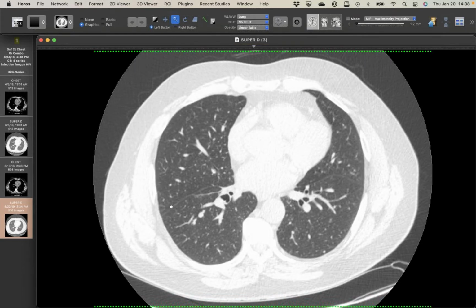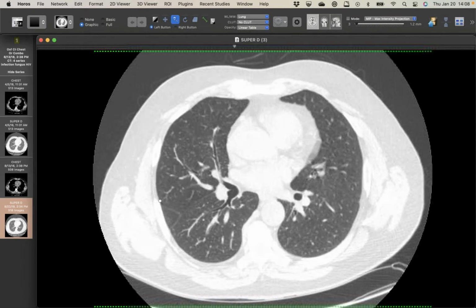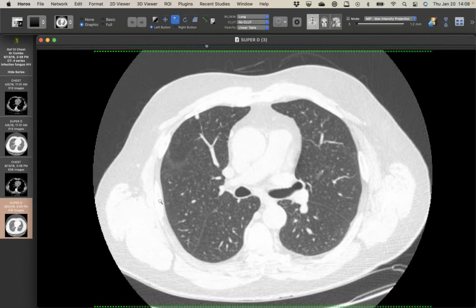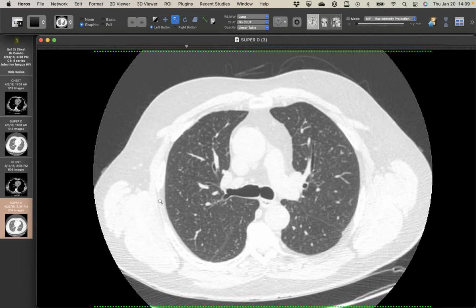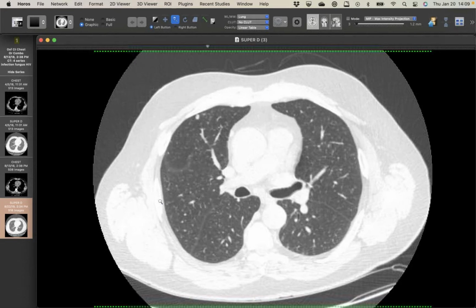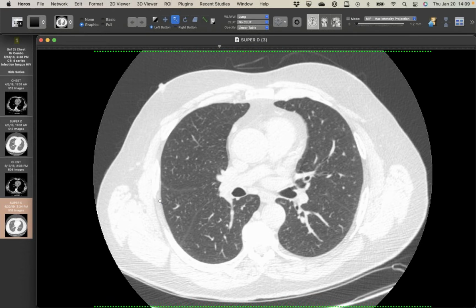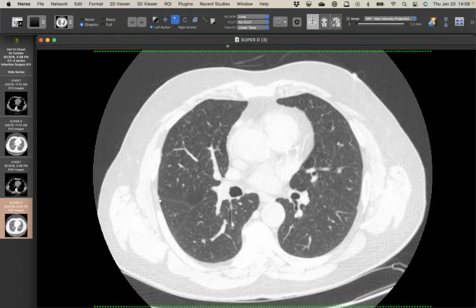So even with full treatment, this didn't go away completely. And that's not uncommon with Cocci. Sometimes, especially the cavitary lesions will persist and never clear up despite treatment, and you can't recover any organisms. Now this may be confounded by his HIV. At the time, I think he had detectable viral load, and his CD4 count was lower. And as David has mentioned, that's one of the risk factors for disseminated Cocci. As far as I know, it was only in his chest.